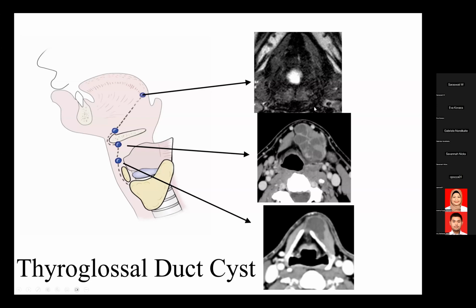Now, a couple of things here about the thyroglossal duct cyst is that it can have variable appearance. So point number one, in a child that presents with an anterior neck mass, especially in a pediatric hospital for sure, but especially if you live in India or in South America or in other places where you don't have as much CT, ultrasound is the way to go. So I'm clearly not suggesting that you perform CT scans on suspected cases of thyroglossal duct cyst. But what I did want to do is go over these imaging findings because they can be a little confusing.